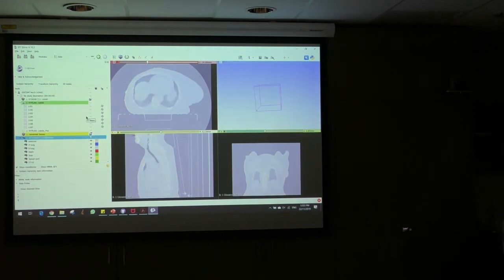What's the difference between this function and if you go back and then there's like build and merge and build? So what's the difference between both? Because merge and build. Yeah. So if you've got two separate segmentations of your 3D render, basically, or your contours, if you've separated them by a couple of layers, but they're a part of the same segmentation, sometimes the software can't register that.